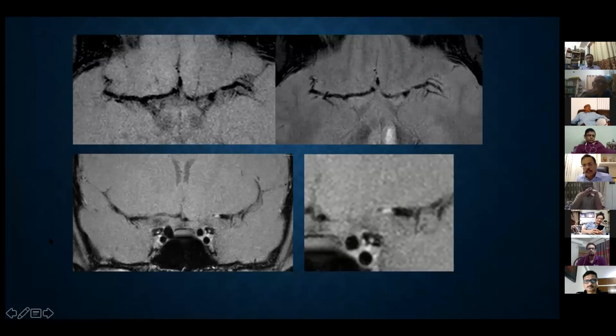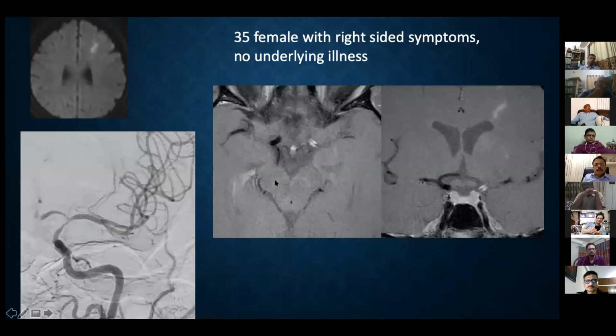This patient I've shown before, with diffuse intracranial narrowing. Again, we don't know what the diagnosis is, but when we do vessel wall imaging, we can see diffuse thick enhancement in all the planes very, very clearly, which is very suggestive of vasculitis, and then one can treat accordingly.